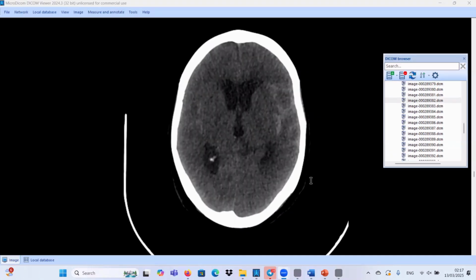I'd like to add some important principles. CT brain in the acute phase, within 2 or 3 days, is more sensitive to detect the subarachnoid hemorrhage. Once we exceed 3 days, CT brain will be less sensitive, and MRI FLAIR image will be more sensitive.